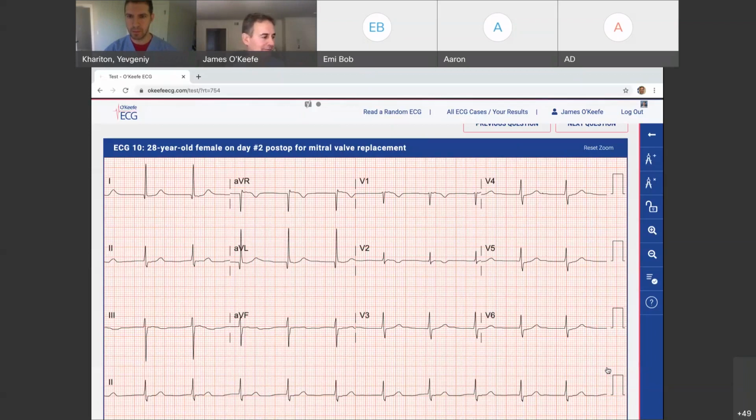We're not keeping score. It doesn't matter. I just don't want to waste too much time contemplating here. I don't see the P waves; they almost seem to be right after the QRS. So this is some kind of junctional escape or junctional rhythm. Very good. I don't know if I would call the LVH on this one because AVL is over 11 millimeters, but I don't know. Yeah, no, you're perfect. There's no reason not to call LVH. There would be if this is a ventricular rhythm.